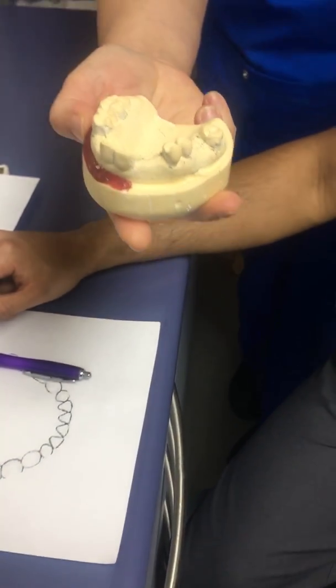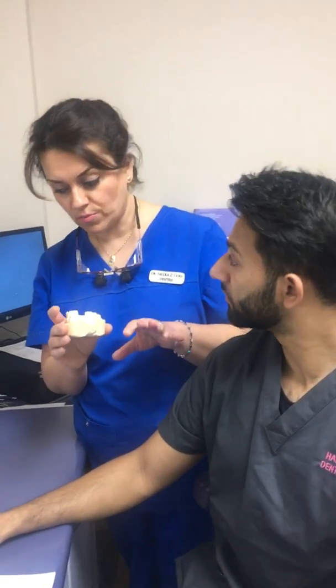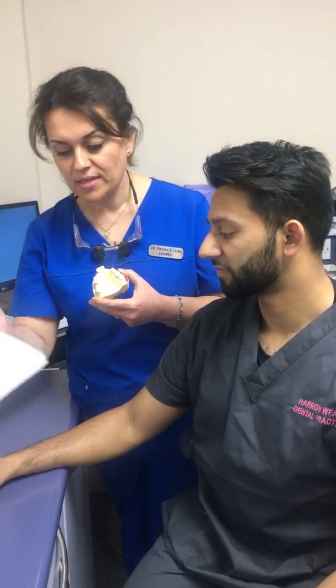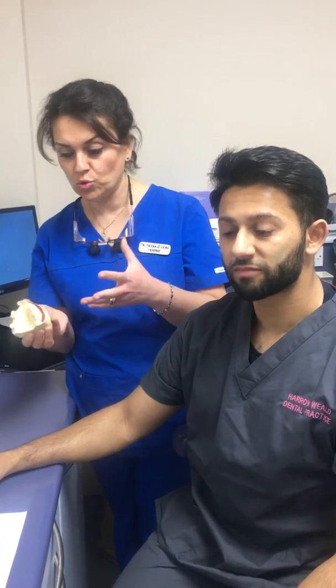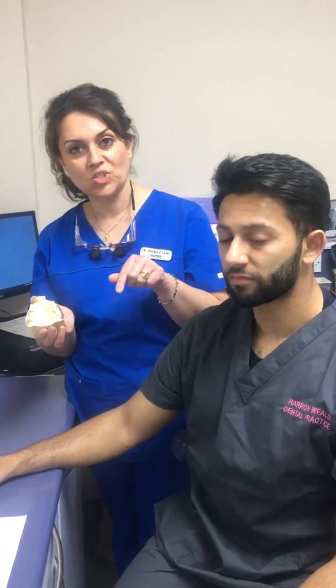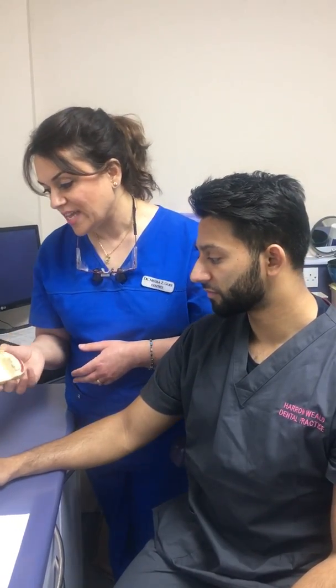Okay, so then the technician has sent back this cast to Nikhil, has sent back some special trays to take impressions in, and has also sent a sheet for denture design. So Nikhil, being very organized, 2 days before the patient arrives, has looked at his model and has designed a denture, and he's going to talk you through what the denture design is, which he's halfway through now. So when the patient comes and is sitting in the chair, you don't really need to faff around with denture designing, because your denture design is there and you can go straight into prepping the teeth before taking the secondary impressions. Okay, so we've now got to the retention phase.